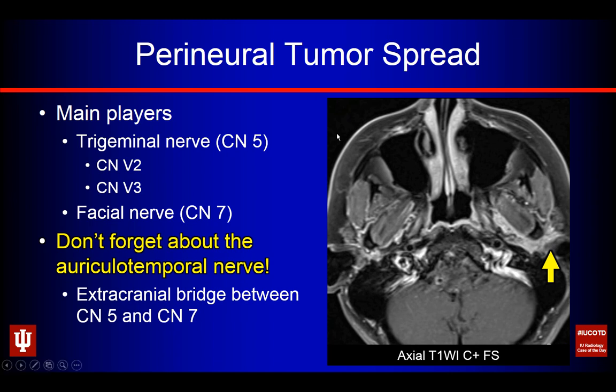We see this soft tissue avidly enhancing within the parotidectomy bed. Uh-oh, this isn't normal. Do you see this cord-like enhancement extending from sort of behind the mandible, wrapping its way over, working sort of anteromedial into the infrazygomatic masticator space? That's where my arrow is at, the infrazygomatic masticator space here. But you can see this cord-like enhancement connecting over. That's the course of the auriculotemporal nerve.